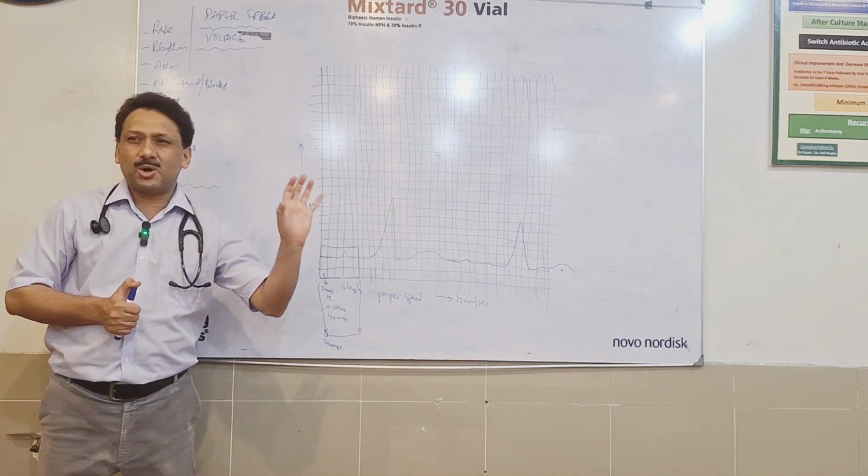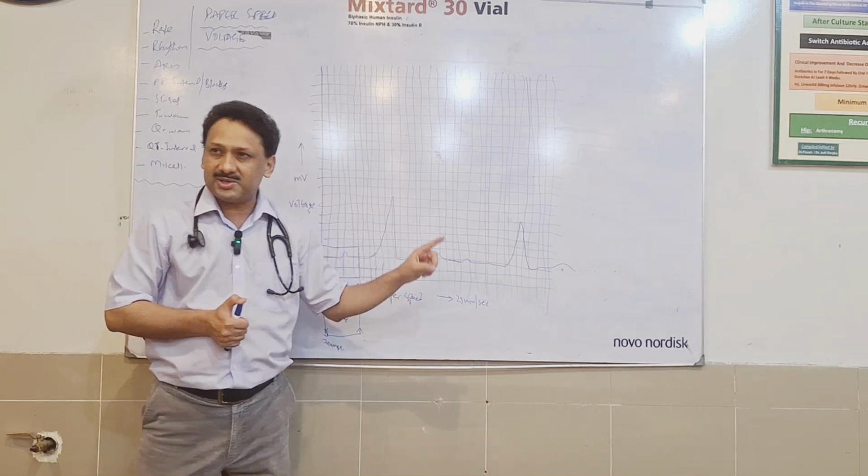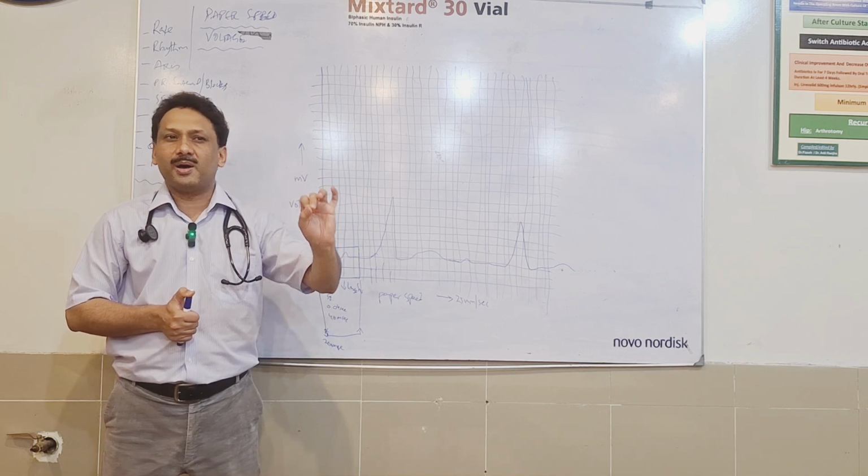So this whole second strip is based on the phenomenon that the heart beats 72 per minute.